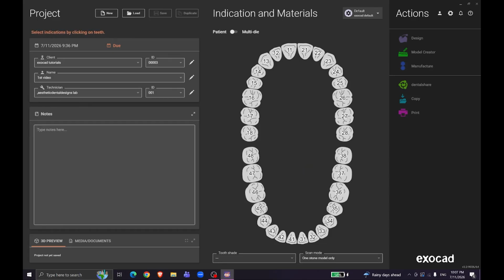Here you can write any notes. Let's say you wanna say for zirconia crowns, or whatever else you wanna say.